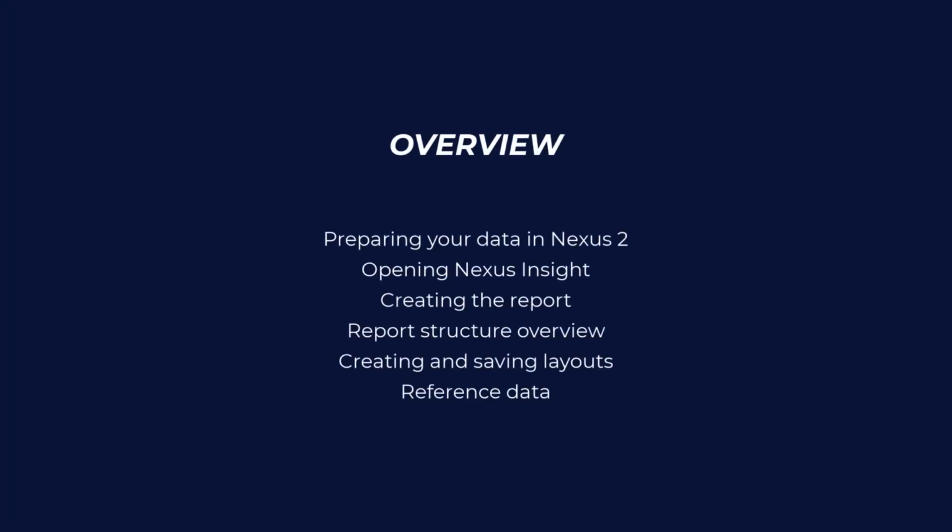Nexus Insight is an efficient, simple reporting solution that provides modern visuals to present and illustrate data. In this video, we will be giving an overview of how to use Vicon Nexus Insight for creation and customization of your reports. This video is a general overview. The specific features mentioned will have their own dedicated videos that will go into greater detail.